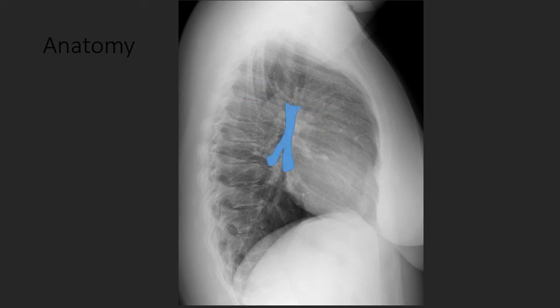After we give off our right upper lobe bronchus, the only airway that we should see running superior to inferior, or vertically oriented, should be our bronchus intermedius. Remember, our bronchus intermedius overlapped the left mainstem orifice on that frontal view, and we can see that here. So this is your bronchus intermedius, then dividing into your middle lobe and lower lobe airways. And notice again how that overlaps with the orifice, or the en face appearance, of your left mainstem bronchus.